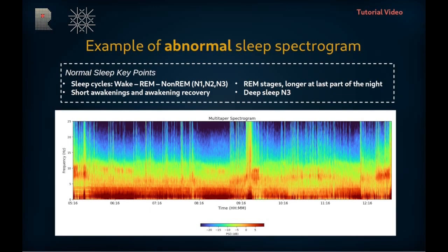In conclusion, this example deviates from normal sleep patterns due to its failure to complete sleep cycles throughout the night and the occurrence of only one REM stage.